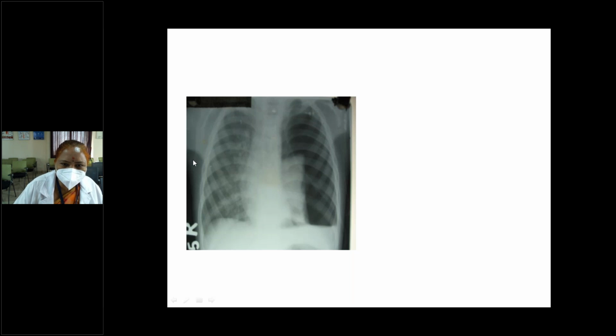Then bony rib cage, you have to comment on the bony rib cage. Any bones here, the neck is not clearly visible, but if there are clavicular fractures, rib fractures, scapular fractures, or if you are able to see humerus fractures, we will mention them. Then come to the cardiac borders, then lung parenchyma.